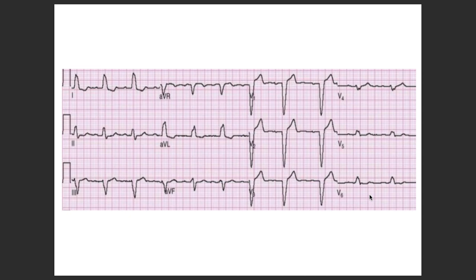Okay, so now further, what else do we notice? So the QRS is wide, isn't it? QRS is normal or yes. So let's go to P now. We are aware. Okay, it seems normal. QRS seems to be slightly bit broad, right? You can always put those calipers and have a look as well.